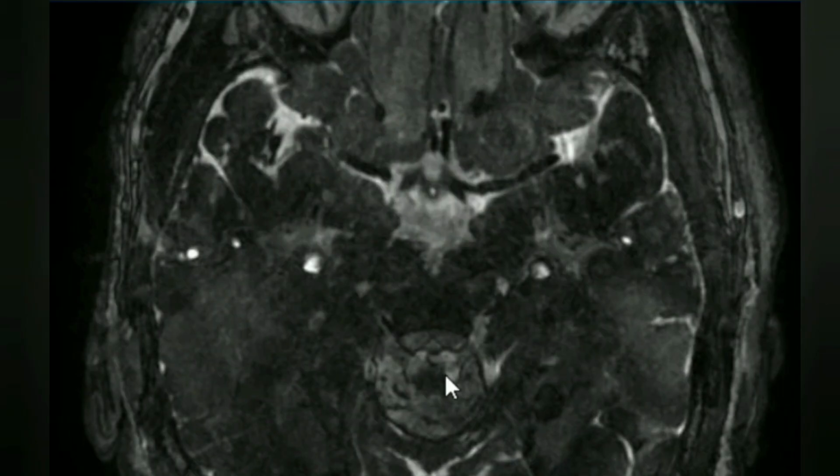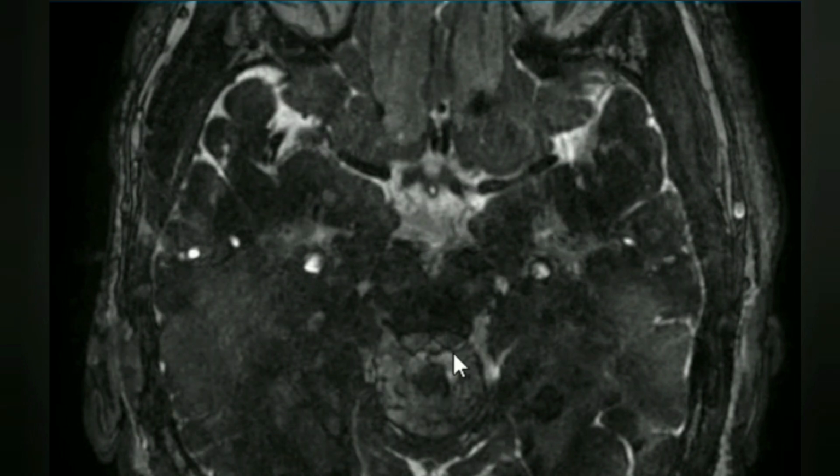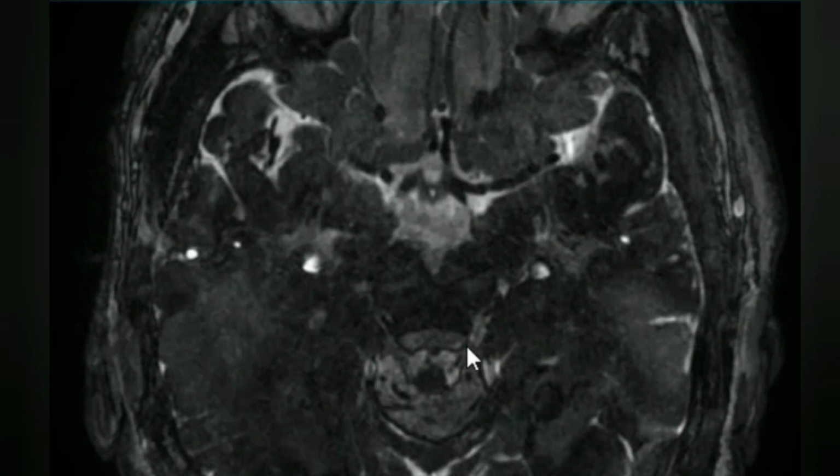The fourth cranial nerve is the trochlear nerve. At the level of the midbrain, this structure is the medullary velum, and anterior to the medullary velum, the nucleus of the trochlear nerve is present. The nerve arises posteriorly, decussates and travels toward the contralateral side.